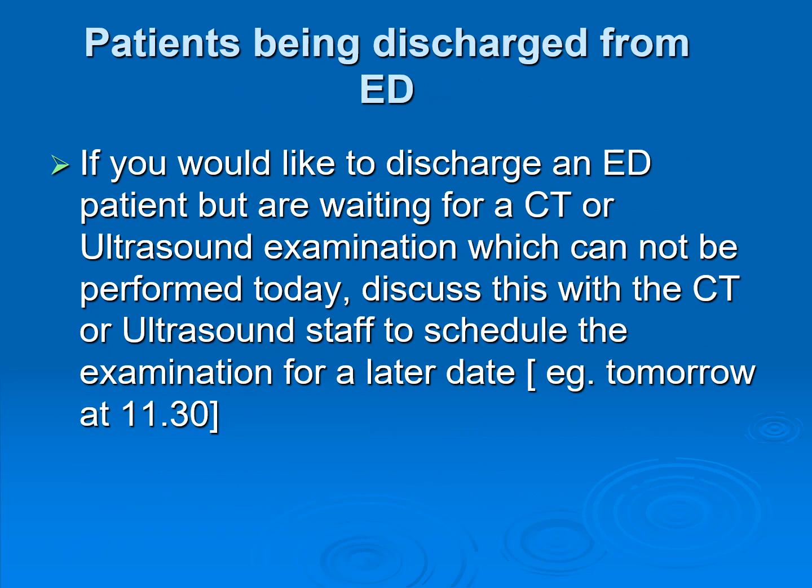If you would like to discharge an ED patient and you are waiting for a CT or ultrasound examination which cannot be performed today, discuss this with the CT or ultrasound staff to schedule the examination for a later date. For example, tomorrow at 11:30. Your patient will come directly to radiology for their ultrasound kidneys or CT-KUB. You may now discharge your patient and they will have their examination under this episode of care or this account. Leave any further follow-up examinations to the GP or request them under an outpatient account. If you have not made arrangements for the scan and discharged the patient, then your examination will be cancelled.